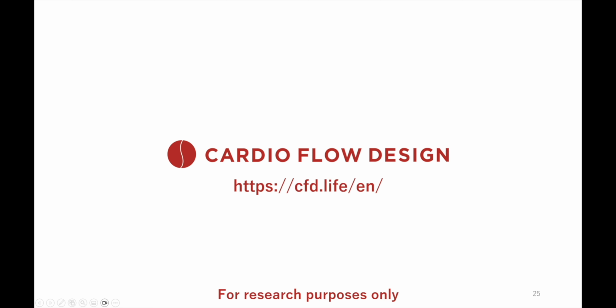bypass grafting, showing significant improvements in flow dynamics and pressure stabilization across the coronary system. This presentation encapsulates detailed analysis of cardiovascular dynamics using state-of-the-art cardioflow design simulation, offering insightful results that will help in assessing and planning surgical interventions.